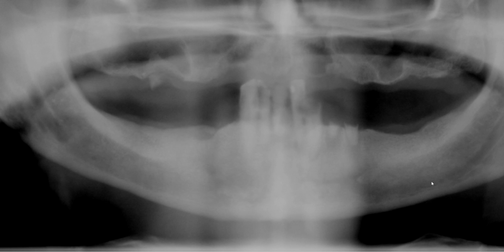So yeah, that's it for me. Anterior loop, just be sure that you can identify this, and knowing the clinical significance of identifying anterior loop is also important.